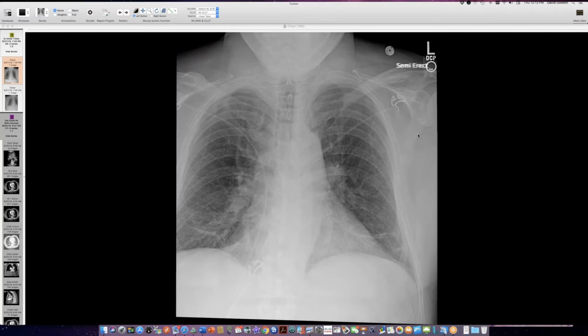So here's a fellow who is getting short of breath, and this chest radiograph, as the symptoms were getting worse, shows a very fine stippling throughout the lungs here. And it's helpful to have comparison radiographs to show that it wasn't there a while ago. So please take my word for it at this point.